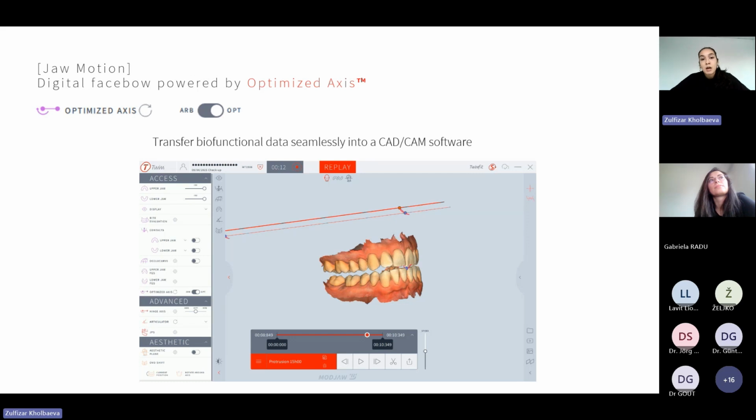So this allows you to correct this axis and to be able to transfer all this data afterwards to your dental technician through Sphere or directly to a file. I think it's a really nice new feature that adds on this face part, and that will be automatically here for all of our users.